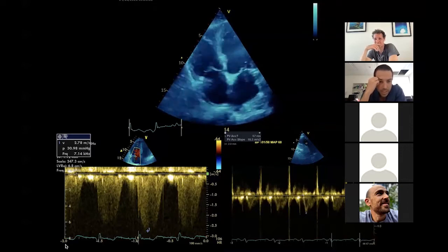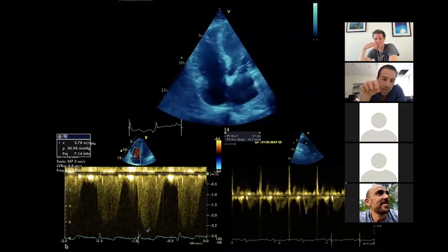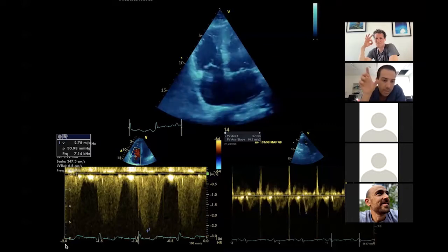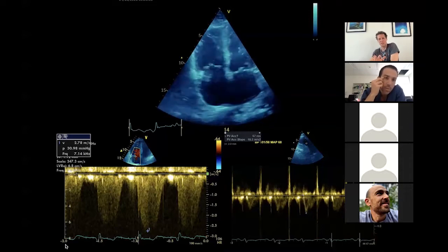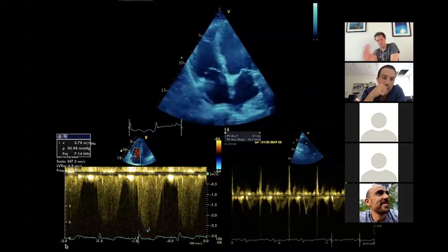I mean, ideally, I'd like to take that acceleration time, and increase or decrease the size of the scale and have multiple measures. Yeah, good job. And that's why I put these 3 pictures together. It's exactly what you've done. And I think even if we hadn't put all these pictures together, you've said it beautifully.